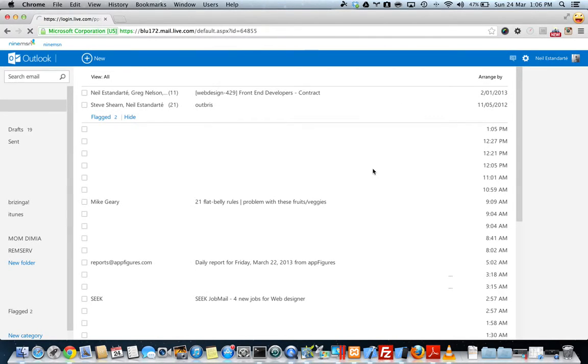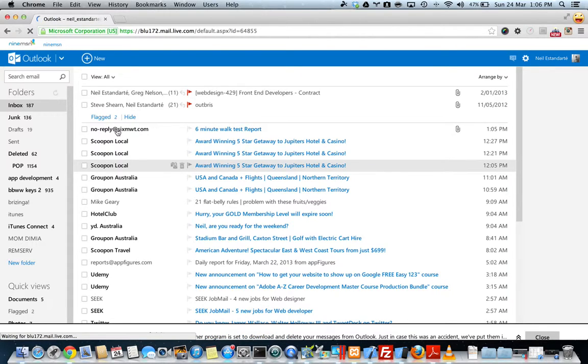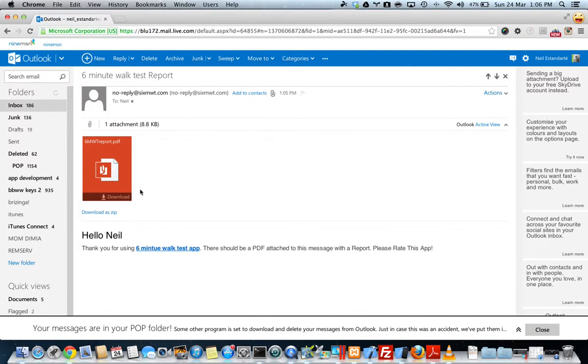Hopefully we should see the report there. Okay, there it is. So, just click on that. Let's see if it'll load it up. So, screencasts always slow down the computer. Sorry guys, but there we go.